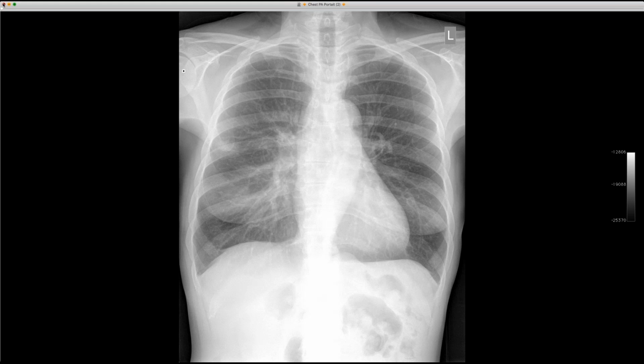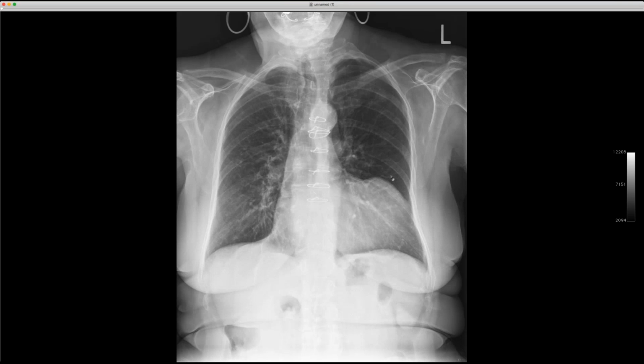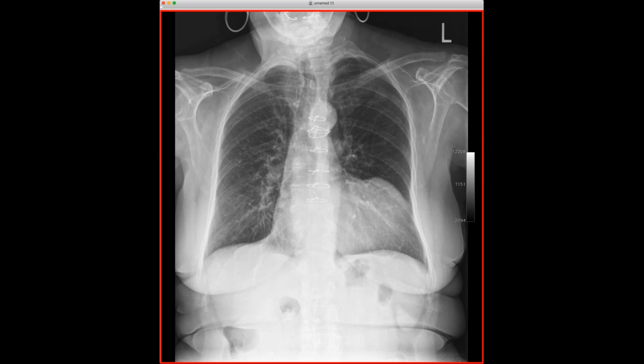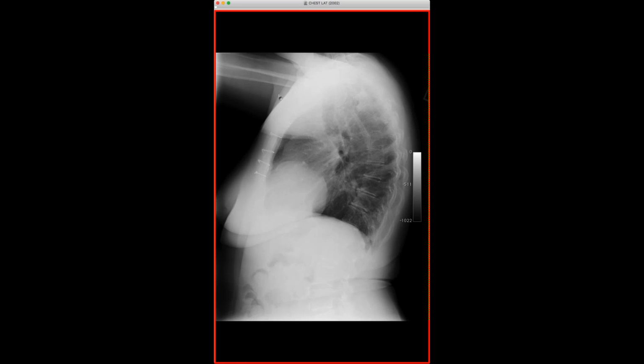Okay, just lastly, since we have a little time, I'll show this case. This is just a crazy case. So here's the radiograph. The patient's had a cardiac surgery. You can see a coronary stent, and there's a big bump there. And then this is a comparison from 6 years earlier. There was a bump, just less conspicuous at the time. So the bump got bigger.